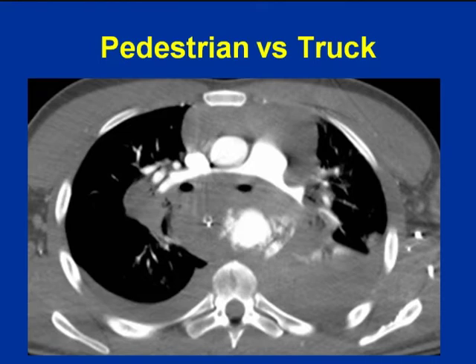If you look at the CT image, it really has all the features of aortic injury. The descending aorta is disrupted and there's active extravasation of contrast into the mediastinum. You can see shift of the airways anteriorly. Look at the mass effect on the pulmonary artery and the hemorrhage in the anterior mediastinum. Unfortunately, this patient didn't do so well.